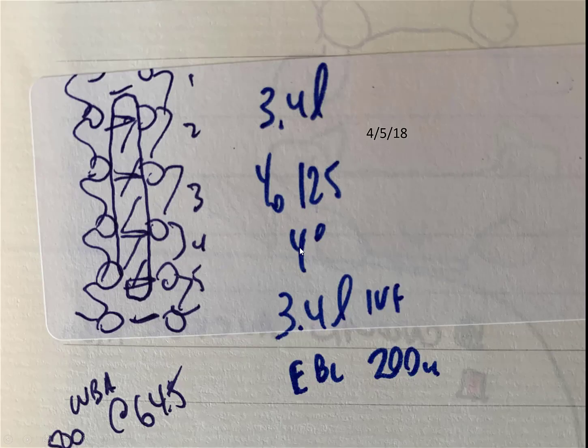What did you see on the left side from the old portholes? Did they fill in with bone? Yeah, and there's a lot of scar, a ton of scar. It did because the facet's hypertrophied, like you said, and it digs into the spinal canal. And it's not only the facets, it's the facet capsule, which is like a synovitis, like in a knee replacement.